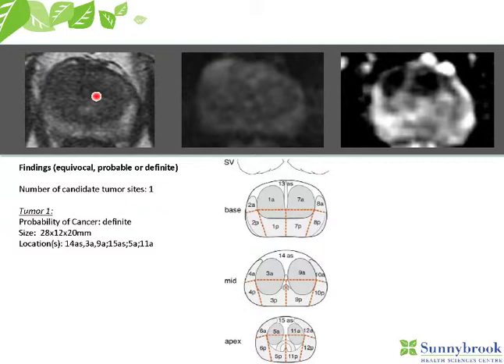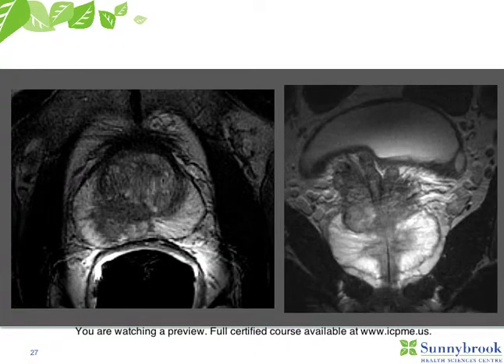And this is where I think you need more experience. As you move to the lower field strengths and move away from the endorectal coil, you will benefit from having had that experience with the endorectal coil or at 3T, but certainly it is more of a challenge at 1.5T, certainly on the older systems. What about staging?